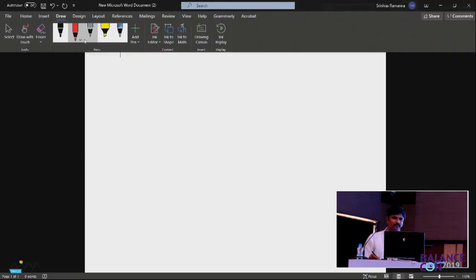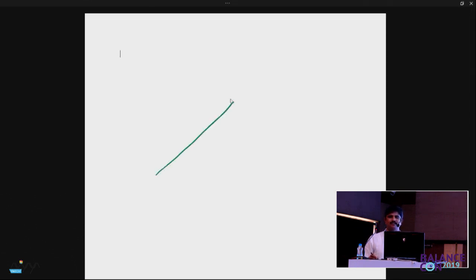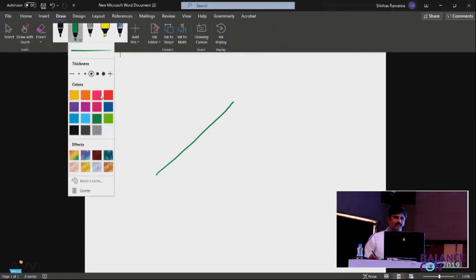Now, the other thing, let us see, it is capable of making the slow movements, but not as fast as the target movement. Now what will happen? If the target was moving like this, if the eye is slower than the target, how will the slope be?